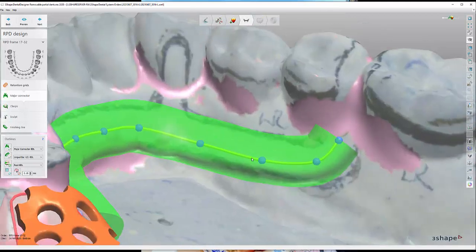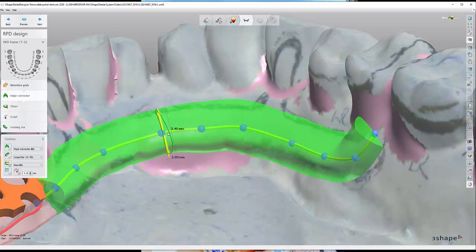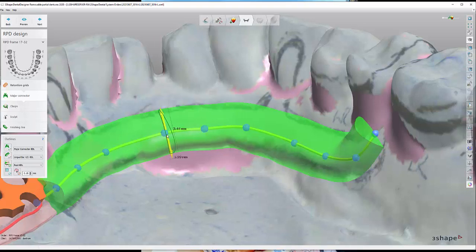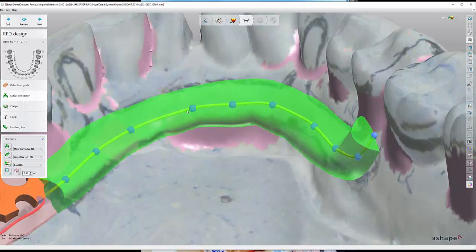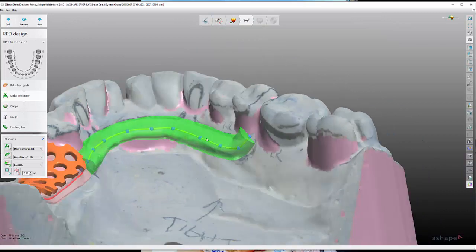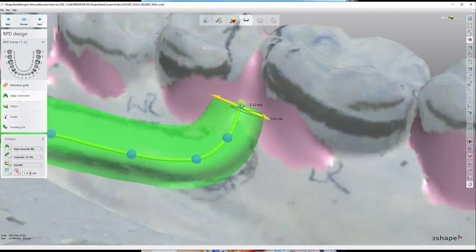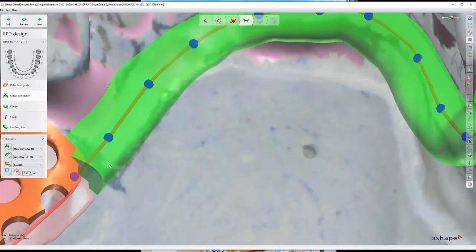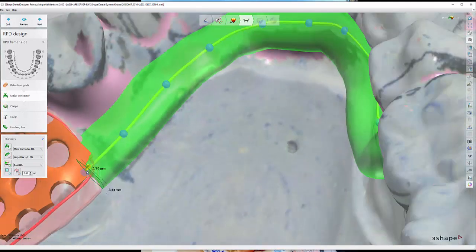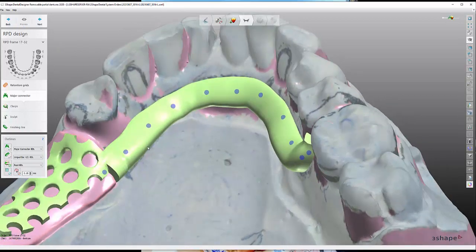You will run into some cases where you don't have quite enough room, and obviously then you could scooch this down vertically a little bit if you have to. Otherwise, we'd rather keep that bar the same width if we don't have enough room, floor of the model. On these, you always want to turn these up because this adds a lot of strength. Turn this up into this upright because this bar has a lot of nice strength. Like that. And I'll actually bring this in a little more and click this down a couple clicks. Hit preview. Okay, that's connected good.